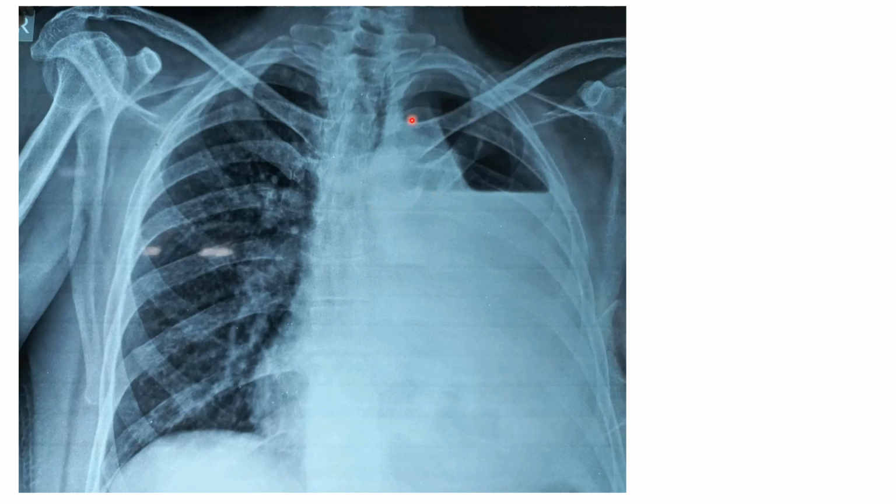And as I said, this is an air. This is in pleural space. This is an air. This lung is collapsed, and this is the lung margin probably. And then this is the straight line, and below you have fluid. This is fluid. Compare the right lung. So this is all fluid. This is the air, and the interface between them is a straight line. This occurs only in erect film.